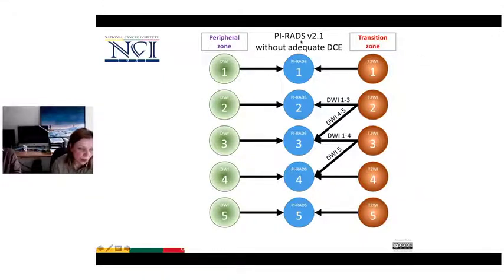And without enhanced images, we will have some consensus discussion about these situations, when patients sometimes refuse contrast or it cannot be performed. So then, of course, we take into account diffusion images, and sometimes it's quite enough. We will see, and it is called biparametric MRI, not multiparametric.